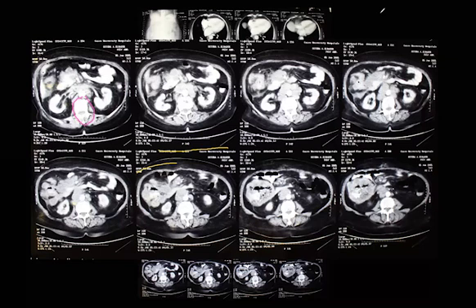Yalla, tell us now, look at the aorta, what is around it this time? This is the aorta, where is the aorta? There is something around it, here. Okay, here is the aorta and here is what's around it exactly. Yalla, describe it, again introduce your CT image. Just tell something about it. Okay, this is CT abdomen axial cuts with IV contrast and oral contrast.